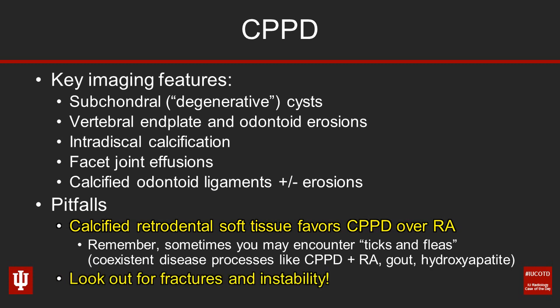And then lastly, always be on the lookout for things that are potentially going to harm the patient. In this case, look out for those associated fractures and potential instability at the craniocervical junction.